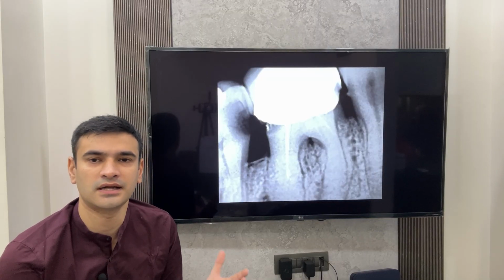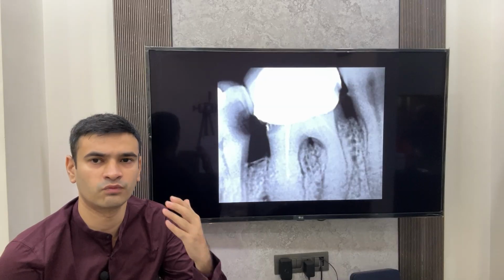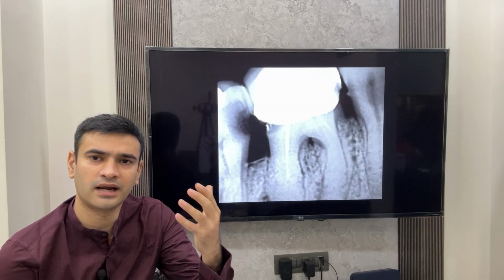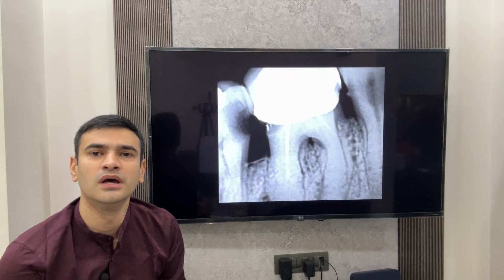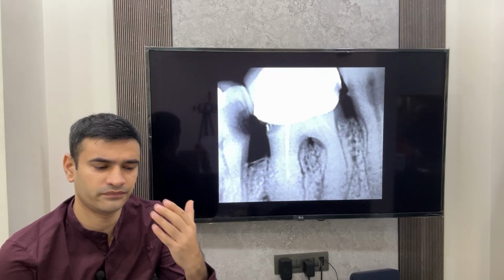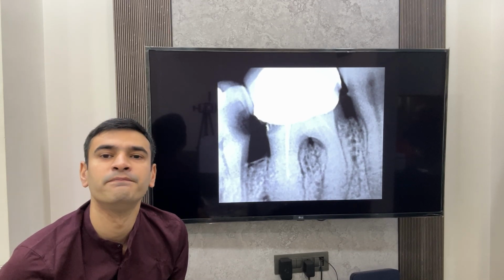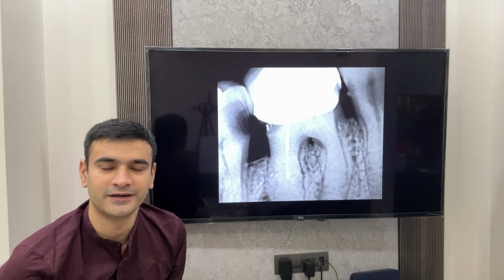In the first part, I'll try to show you what information we can get just by looking at the IOPA, or what goes into the mind of an endodontist when we look directly at the patient's IOPA. The second part will include a clinical demonstration of how to remove gutta-percha. Now this will be the second part. So let us start with the first part.